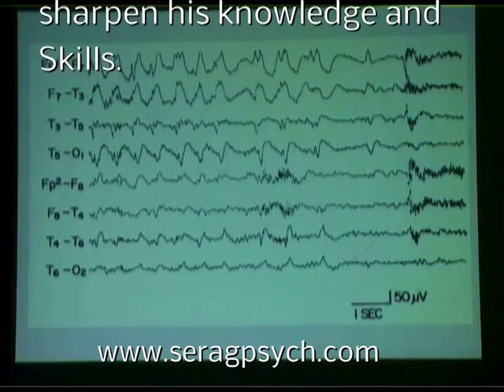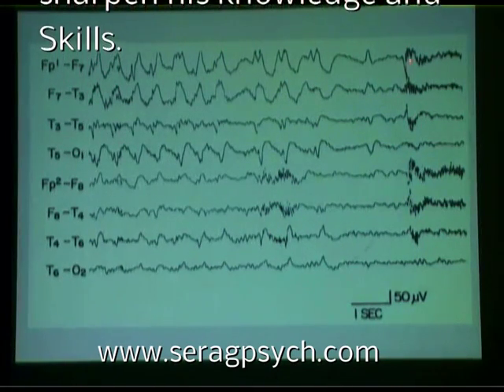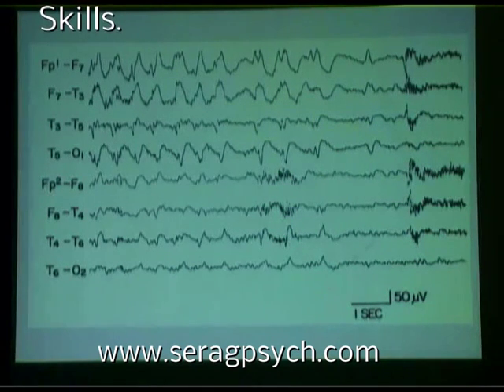And you notice that this represents chewing or swallowing. Patients with automatisms usually don't start them at the beginning of a seizure. Automatisms of chewing or fumbling with the hands take a few seconds before they're manifested in a seizure. So next, please.